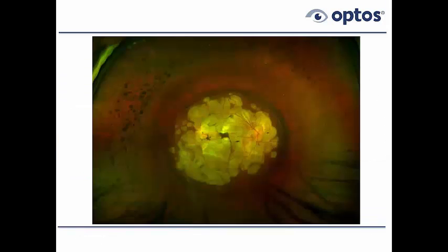The general rule is that Optos, Daytona, the one that we're using in this instance, or all Optos images, are using laser, and laser penetrates better than white light. So we actually get better penetration, better images. If you have a 4+ cataract, we're not going to be able to go through it. But a cataract that may hamper you from seeing the fundus with even a binocular indirect, you may be able to get a relatively good Optos image on it. So generally, it does better than standard photography and does better than standard ophthalmoscopy because it's using laser, and the laser does seem to penetrate better.